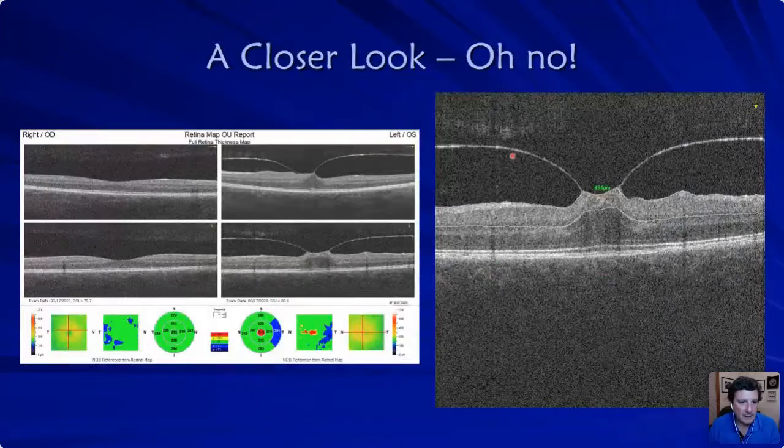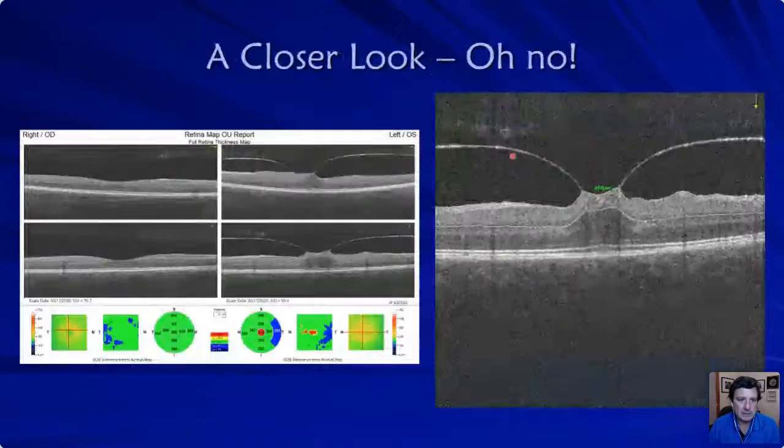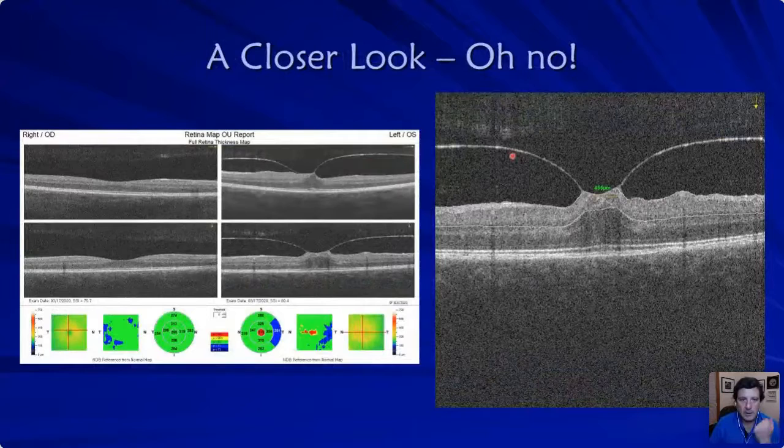Do I have her follow up? Yeah, she cleared up nicely. This is her right here. I was hoping that I had the follow up. So this, again, focal, right? We got to be careful with them. Here's another, focal, but everything's intact. Again, here, this is how you can measure. This is how you can tell it's focal. You kind of want to go parallel. When you read the paper, it will say try and stay parallel.